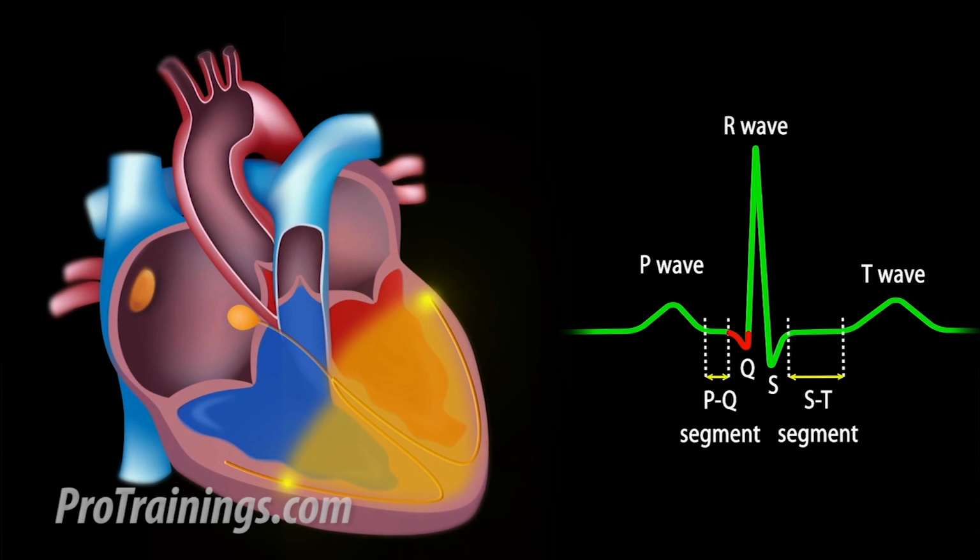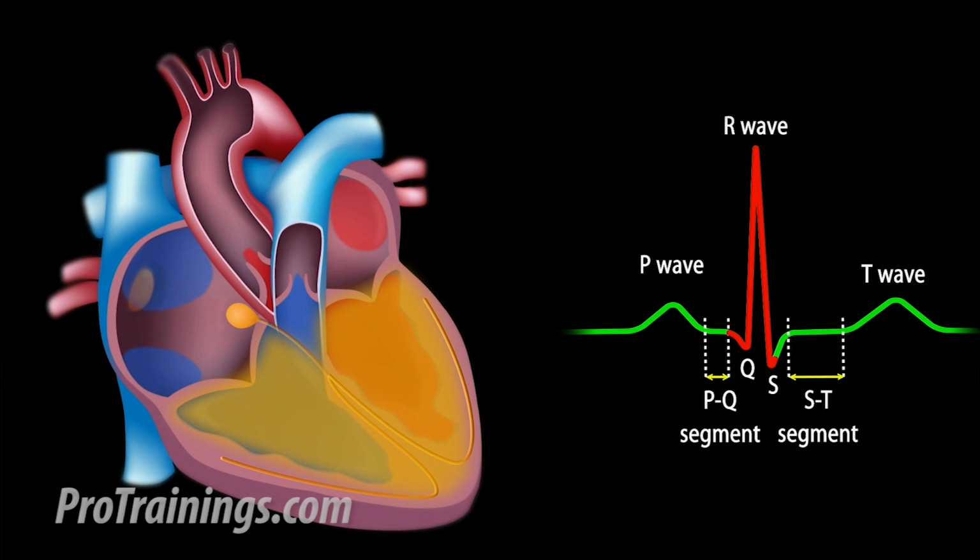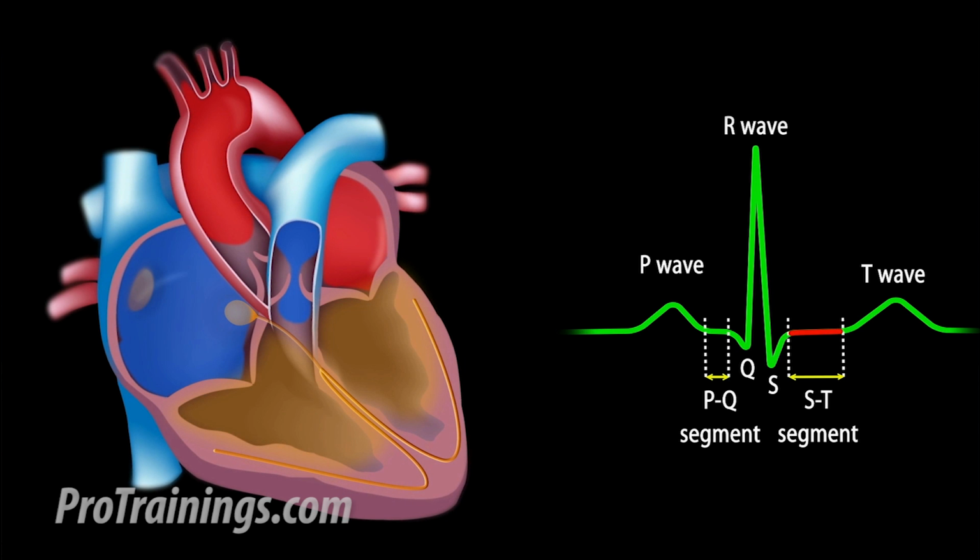We'll discuss the significance of Q wave formation specifically as it relates to certain dysrhythmias in each of the rhythm evaluations. Now, the R wave is the first positive deflection after the P wave and then is followed by the S wave, which is the first negative deflection after the R wave. The time frame between ventricular depolarization and repolarization is indicated via the ST segment. The ST segment is the baseline of the cardiac cycle and therefore is electrically neutral. There should be no inflection or deflection as it's isoelectric.